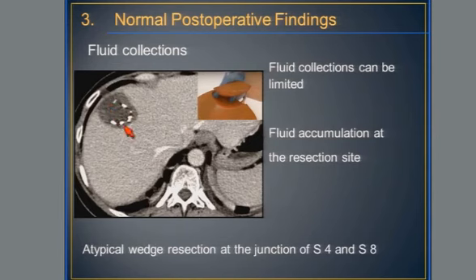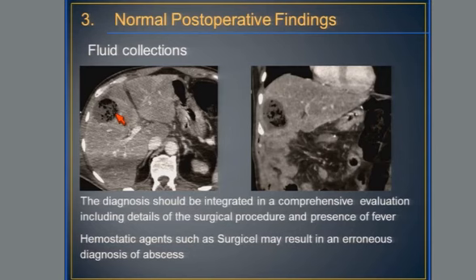Fluid collection can be limited. In that case, this is a patient who had a wedge resection and there is a small fluid collection at the operative site. Fluid collection sometimes can be misleading. This is a recent case we had, and we were very concerned about this fluid collection with gas bubble inside, and unfortunately the patient had fever too, so we did direct puncture of the fluid collection.